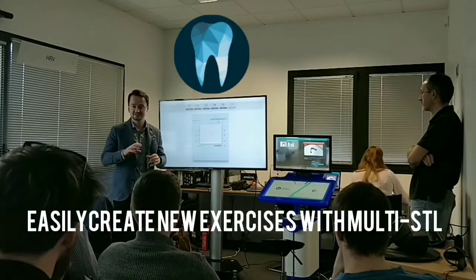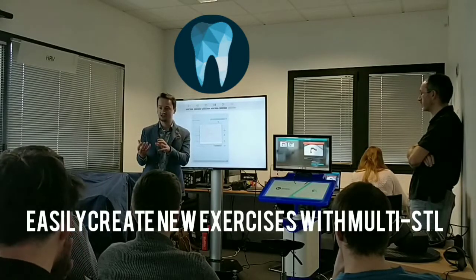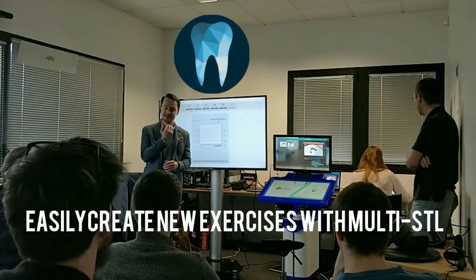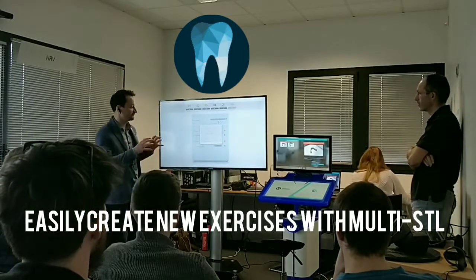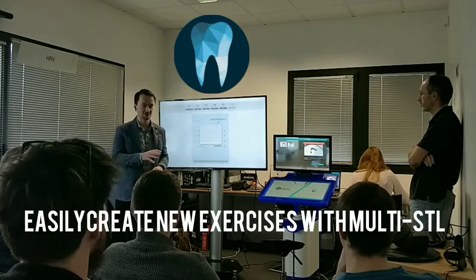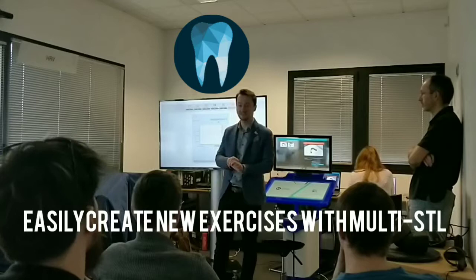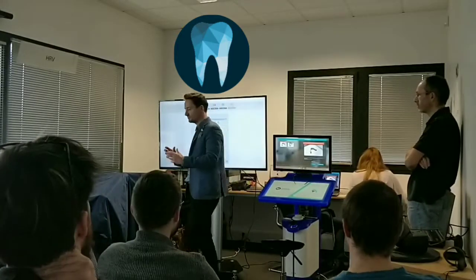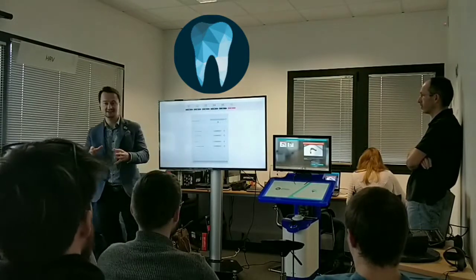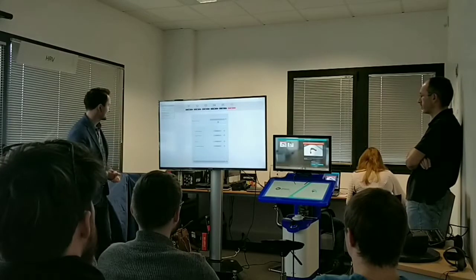So that means taking a CT scan, which is in DICOM format, from a real patient, and then getting their segmentation, potentially from an intraoral scanner as well, and then creating a full case from that information. So that means we can set up patient profiles, we can set up their age, how many times they've been to the dentist, and what their problem is, and then create that exact case for students. So here we're just going to launch the process for our implantology DICOM workflow.